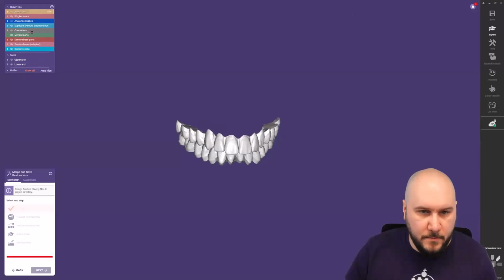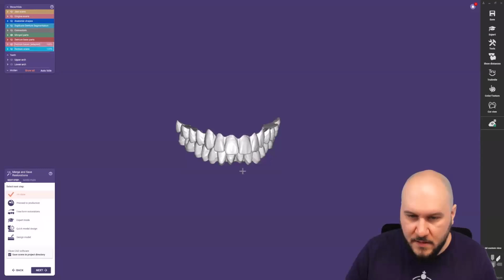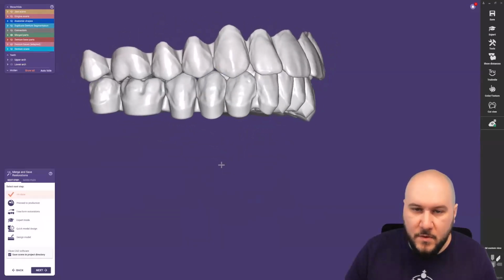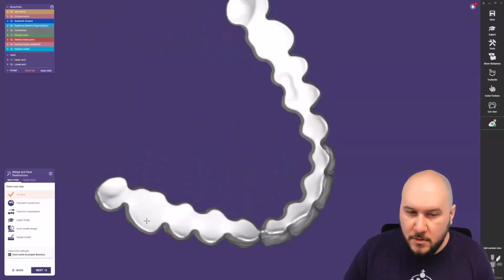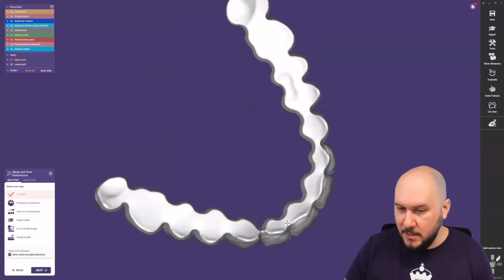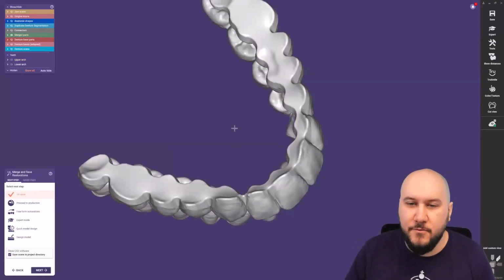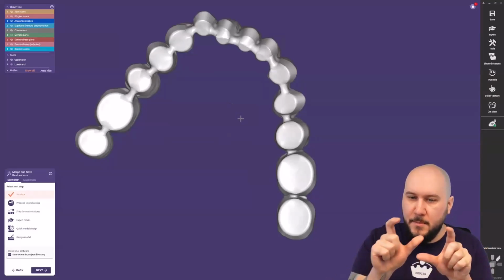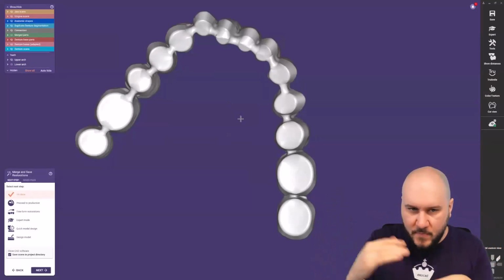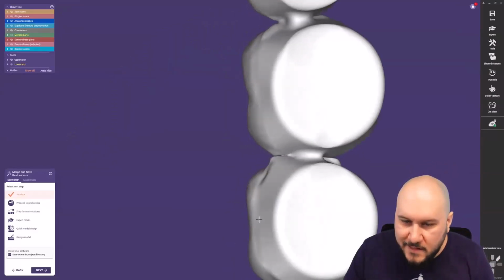Then we have denture parts, then we also have the jaw scans, and we also have the Denture Base adapted. Yeah, and this is the difference I just wanted to show you between upper and lower jaw. The upper jaw has this enable individual custom bridge button, and looks more stable and closed in this case for the connectors. When we see the bottom part, where I don't change the connectors with the position and the height and the size and so on, there we have these little edges, for example.